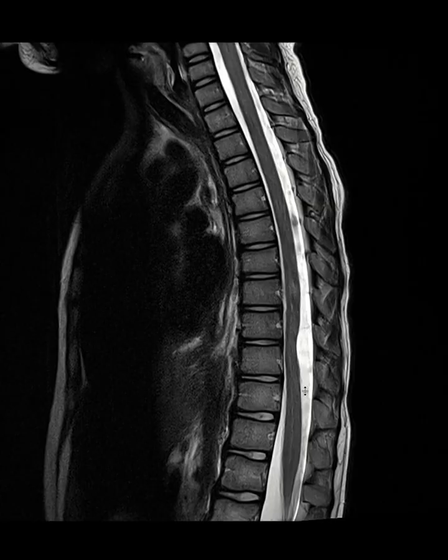The other one is thoracic cord herniation. In thoracic cord herniation, we have a defect in the dura that causes the cord to herniate. In that situation, usually there is no space between the thoracic cord and the ventral aspect of the thecal sac. You see that there is a sliver of CSF still here, so it's not completely gone. That's another differentiation between this entity and ventral cord herniation.